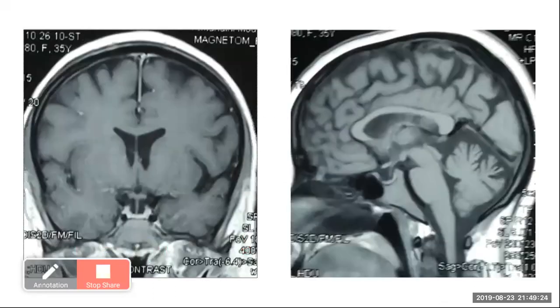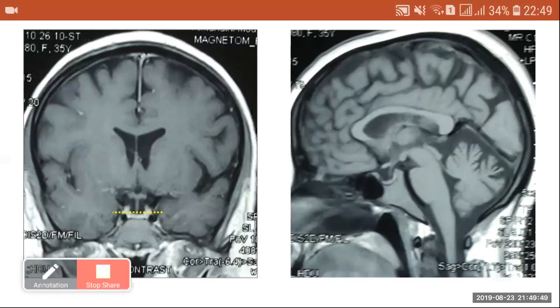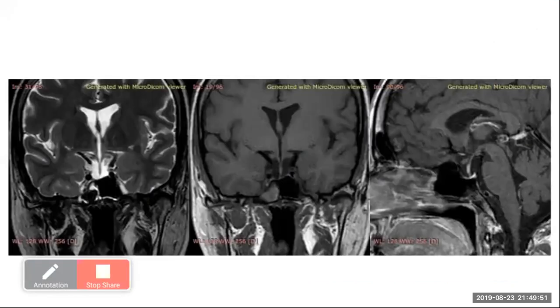This is another case of pituitary empty Sella, actually. There is also another hint to know if this is really empty Sella. We draw a line just above the carotid arteries. If the pituitary stalk just reaches this line, so it is empty Sella, like in this one. Okay. This is also empty Sella, total empty Sella. We see that line and where the pituitary stalk ends. Okay.